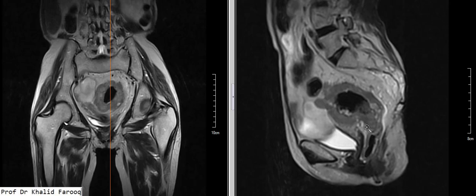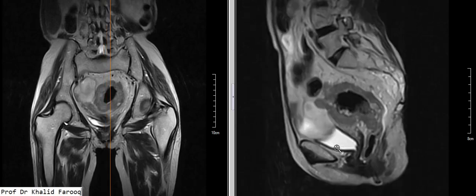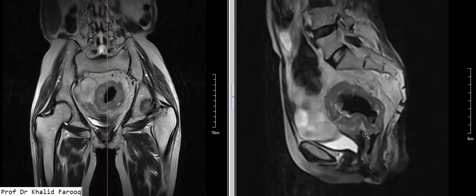Now in this case, we need to see the extent of the disease. Most important thing is that we have to inform our surgeon how much rectum and anal canal is spared. Here we can see that this lower portion of the rectum and adjacent upper anal canal is spared. So we will measure this region and mention it in our report. We will also comment on exact length of the lesion. Similarly, we will mention perirectal space involvement and involvement of adjacent surrounding viscera.